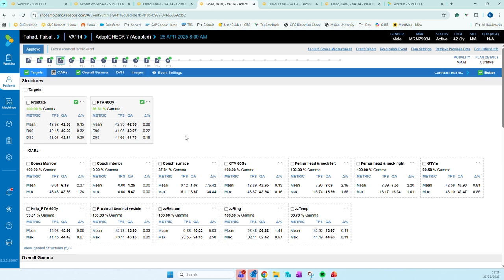We calculate both of those plans in under 90 seconds. If you wish to not use the scheduled plan and have the results so that it does not need to calculate both, then you can decide to switch off the calculation on the scheduled plan. Our feedback has been that Ethos users will almost always use an adapted plan, therefore they don't need to waste time waiting for that scheduled plan to calculate.